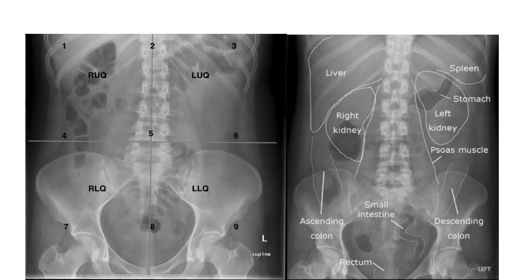When we go to report an abdominal X-ray, we read as always from outside to inside. So we start with soft tissue, bones, and then we jump inside the abdomen. For radiological purposes, the abdomen is divided into four quadrants: right upper quadrant, left upper quadrant, right lower quadrant, and left lower quadrant. We have to look for the marker showing whether the side of the patient is left or right, and in the majority of cases the X-ray technician will clarify whether it is a supine or erect position.